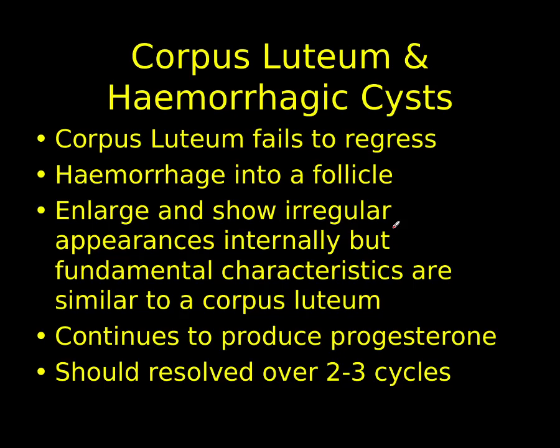The patient may then be brought to the hospital or may be given an appointment to attend for an ultrasound examination for abnormal bleeding, and a hemorrhagic cyst may be discovered, and we have to make sure that we don't attribute that to a cancer and we correctly identify it as a hemorrhagic cyst. Hemorrhagic cysts should, like follicular cysts, resolve over 2 to 3 cycles.